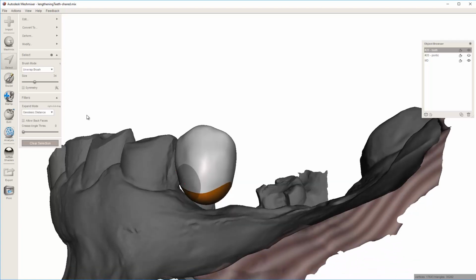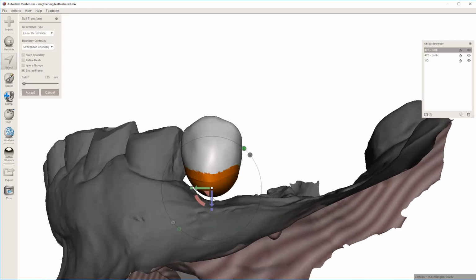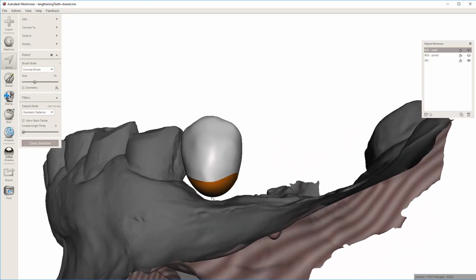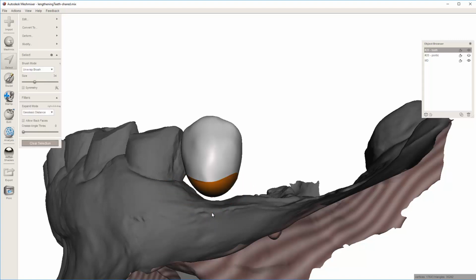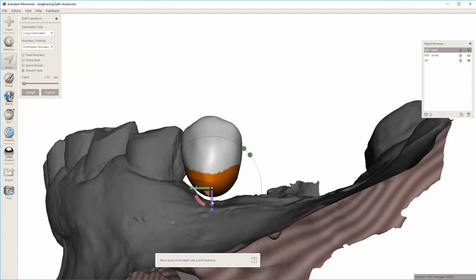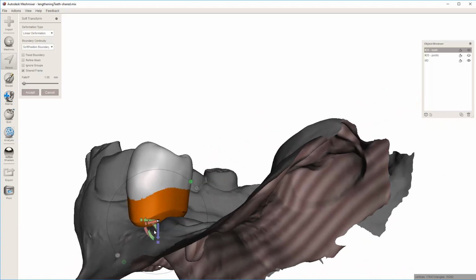You could instead press Shift T, which is a soft transform. Let's go back to T. If I slide it down, it's very straight. If I hold Shift and T, which is also in the modify transform, soft transform, I can slide it and it warps it a little bit along the edge.